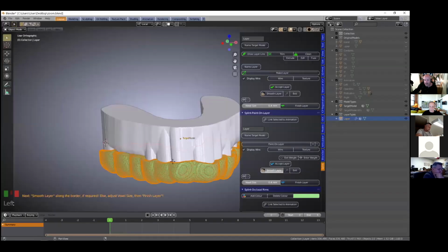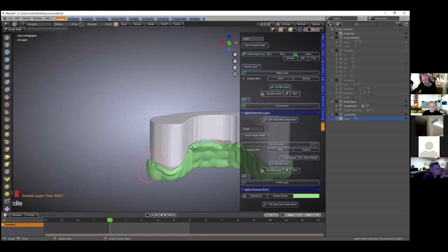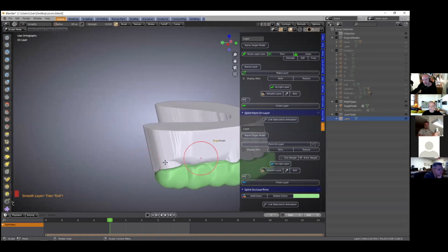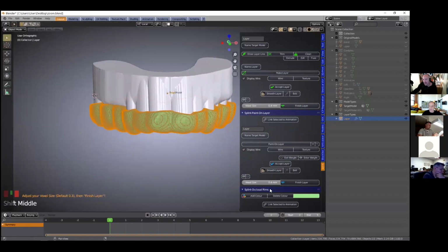And again, we can give it a quick smooth. So here you're just focusing on the borders when you're smoothing, or in between the teeth as well? No, just the borders. After you hit the exit button, you always get the remesh option. Yes. Okay, so that's one.